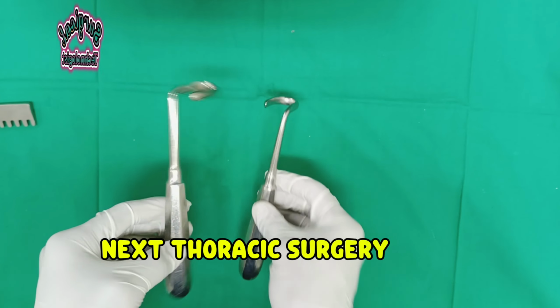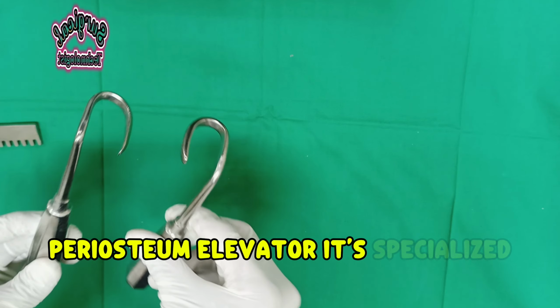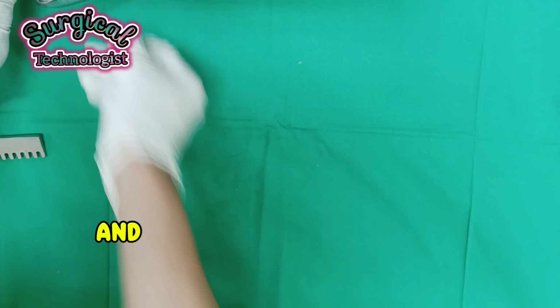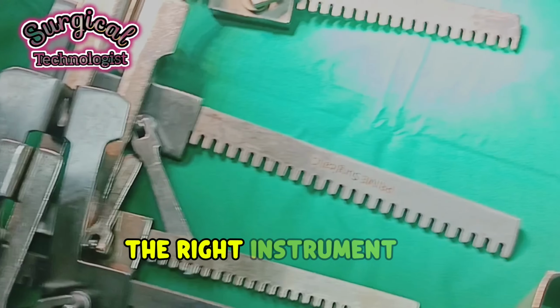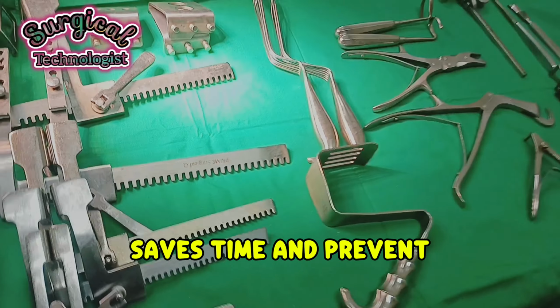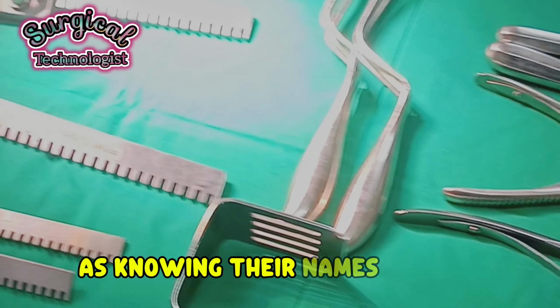The next basic thoracic surgery instrument is the Doyen rib periosteum elevator. It's specially designed to elevate, scrape, and separate the periosteum from the surface of the ribs. In thoracic surgery, the right instrument at the right moment saves time and prevents tissue damage, so knowing them by shape is just as important as knowing their names.